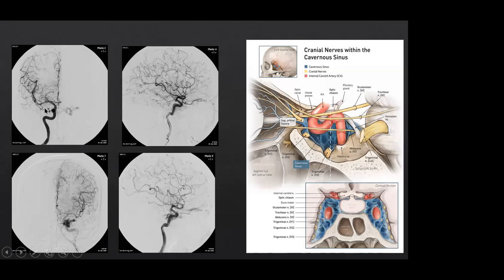This is a right internal carotid angiogram, and this is to show you how the disease actually is on the left side. And you can see these are the branches from the right internal carotid artery which go across the sella and are highlighting the venous plexus surrounding the carotid artery. So this central hole is actually the internal carotid artery that we are seeing, which is highlighted. So this is the same internal carotid artery on the opposite side over here, which is being highlighted, but the artery doesn't opacify because the injection is on the right side, and the contrast is actually surrounding the carotid artery.